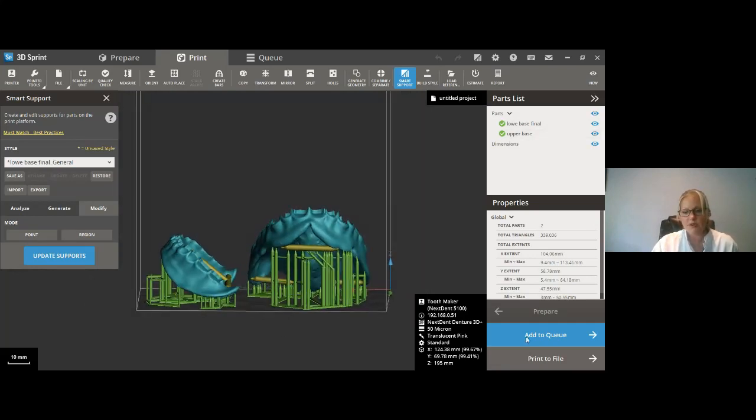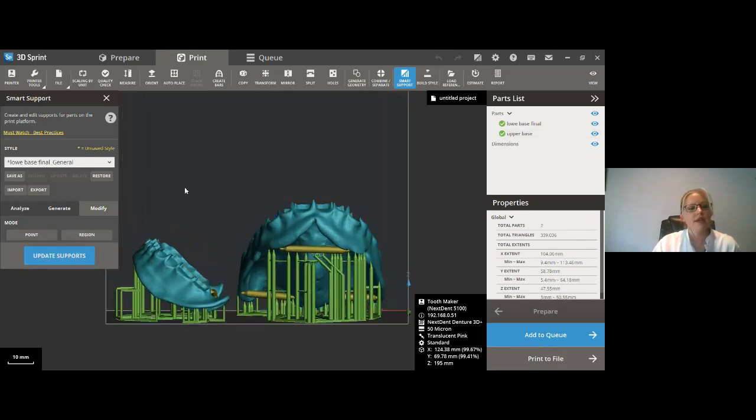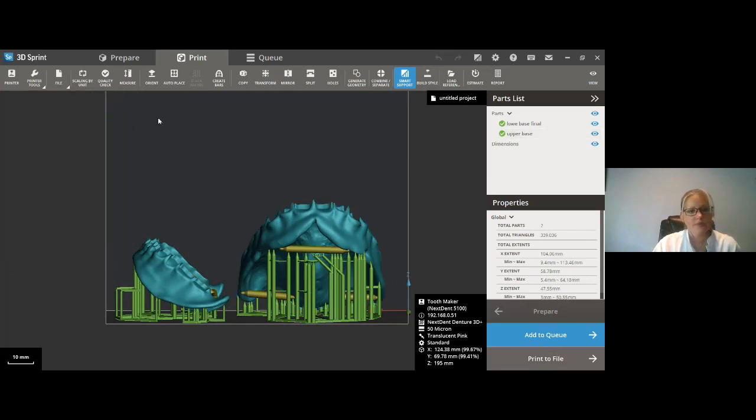And you've probably noticed sometimes that when you add some supports that they may disappear. You don't see them on the UI. We've improved that function, by the way, that visual function.